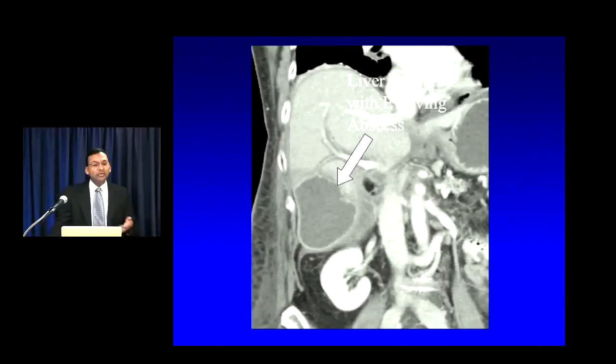Now, this is what you don't want happening, right? This patient had a large right hepatic lobe infarct. They actually had, I believe, a replaced right hepatic artery that wasn't noted at surgery or on preoperative imaging. And that infarct has gone on to develop into a biloma. The biloma got superinfected, and now you've got a big infected infarct or infected liver abscess.